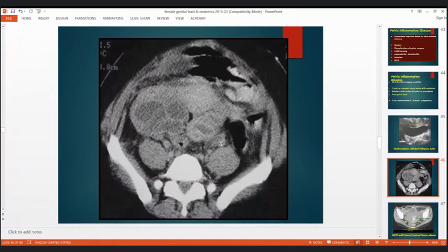So this is a CT scan of the pelvis showing a large mass lesion. Bilateral adnexal lesions, you can see here that this is a cystic lesion with multiple internal cystic contents, thick wall, thick septation, and enhancement. So this could be a tumor, but in the clinical context of infection, discharge, and raised inflammatory markers, this is a case of tubo-ovarian abscess.